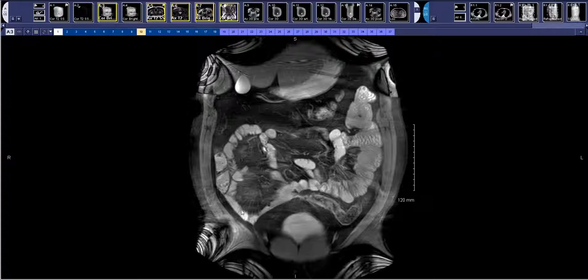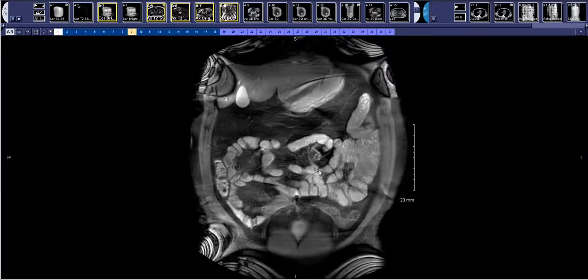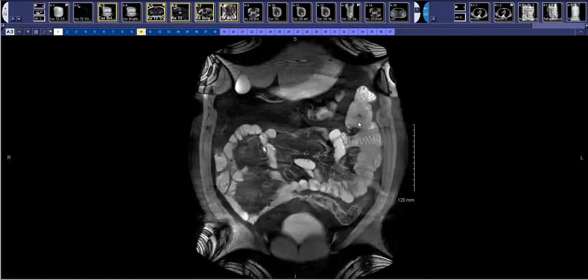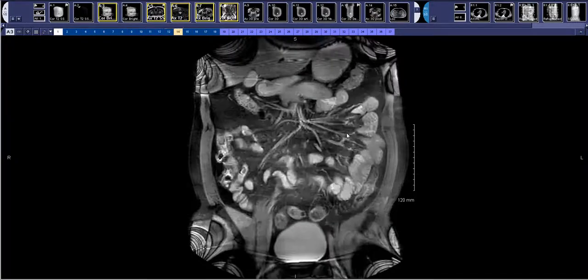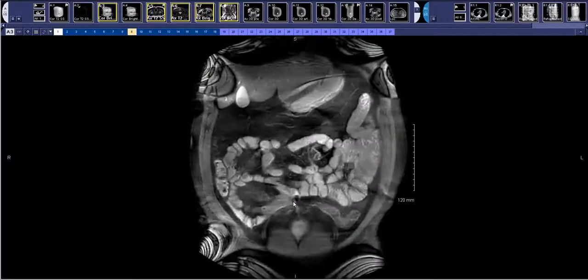So we want to look at the upstream small bowel and see if that's dilated. In this case, it is not. If it is, then that suggests some functional obstruction, and we'd want to describe the location, the length, and the degree of that dilation. Finally, we want to assess the proximal ileum and the jejunum. Give special attention to these areas because they're not assessed very well by endoscopy. So we can provide benefit to the clinician by letting them know of any abnormality in those regions.